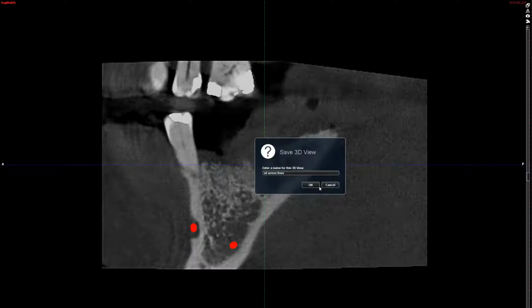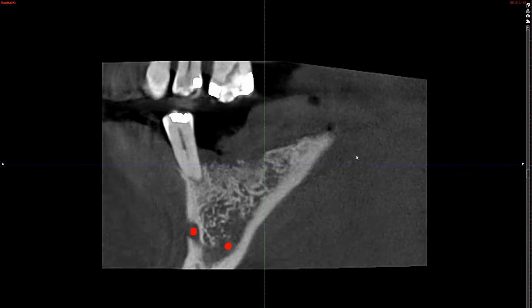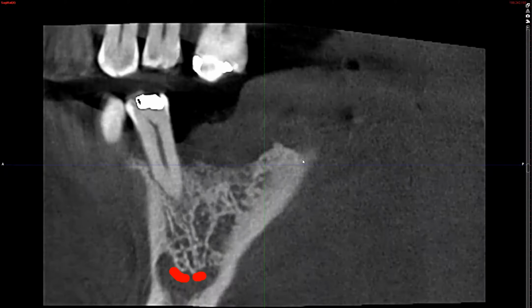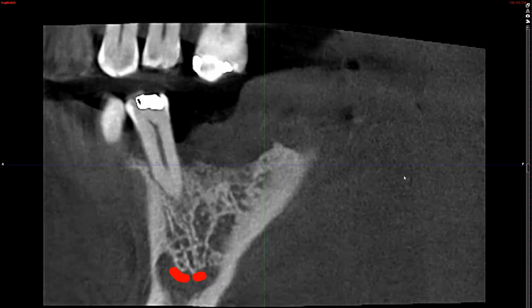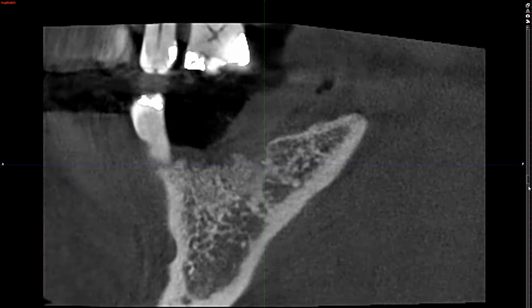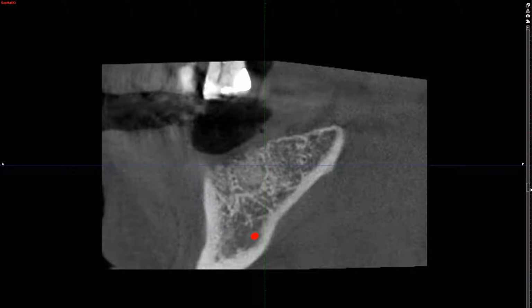It did not like that. Okay, let me cancel that. Okay, I don't know what just happened, but let me zoom in just a little bit. Okay, whatever I did, it's not liking it very much. All right, let's see.